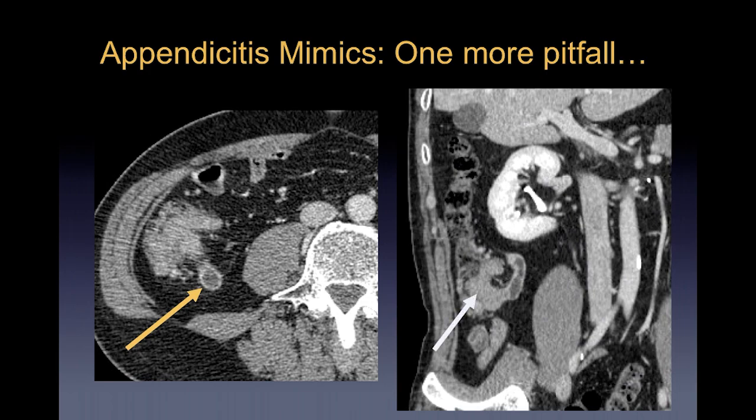The patient here actually has a large cecal mass, which is the reason the appendix looked like this. It was a little bit obstructed. They didn't have appendicitis yet, but there was fluid stuck in that lumen. So that's another thing that I have sort of added to the search pattern, that whenever you do see one of those airless, low attenuation, fluid-filled appendices, particularly if there wasn't clinical suspicion for appendicitis, please do look at the cecum and make sure that there isn't some mass there or some clear reason for obstruction.